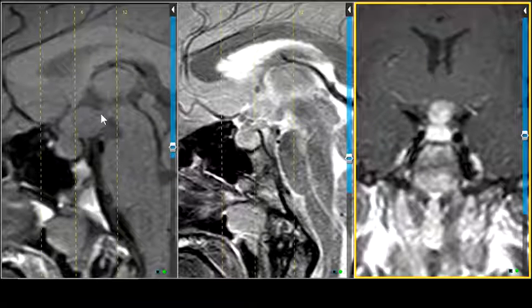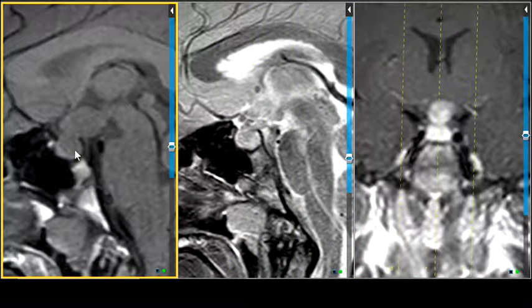So what's our differential diagnosis here? Right. So the sella is not enlarged. So this is primarily a suprasellar mass enhancing in a child. So there is a substantial differential, which could include things like a germinoma, sarcoid, eosinophilic granuloma, things of that sort that affect the stalk and are in that differential of diabetes insipidus, which this child does present with.